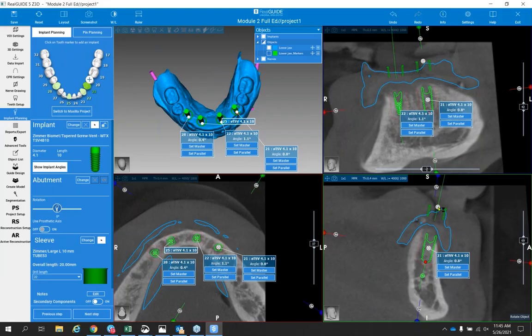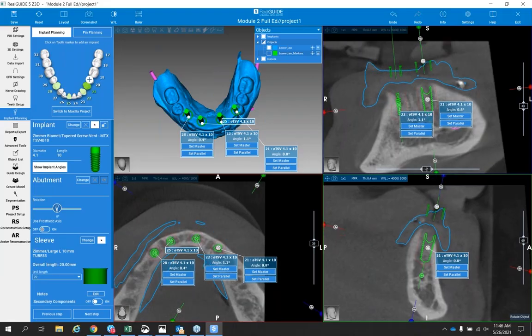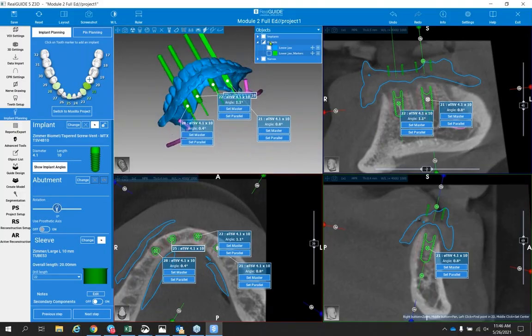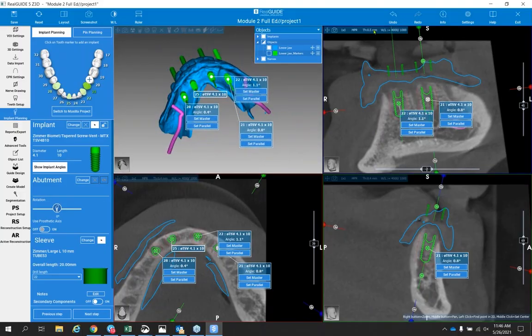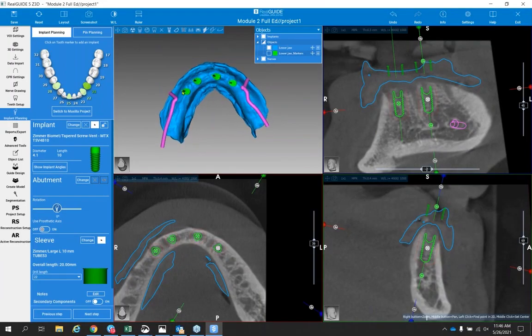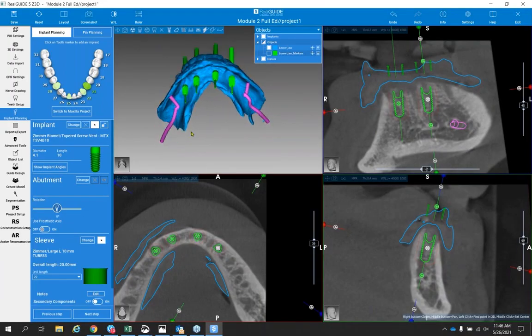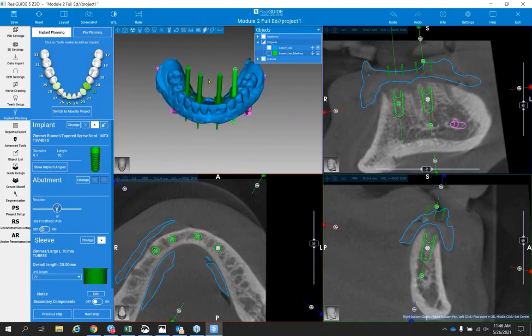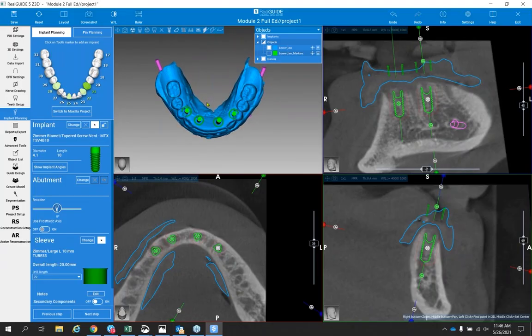Okay, now that's probably a little extreme. What am I averaging here? About 1 degree between all these. It looks a little weird on my cross-sectional view. But how are we doing close to the nerve? I'm turning these off now. All right, again, I'm just taking my time, watching my positions, making sure. You can tell I'm right-handed. Everything's a little bit sloping to the right, right? So we can correct for that.